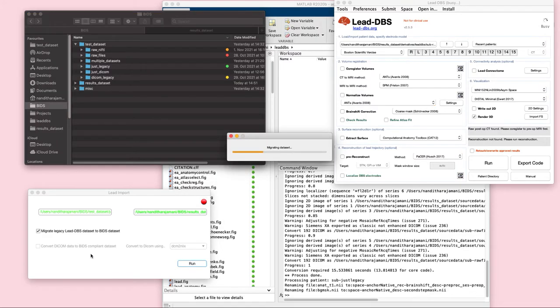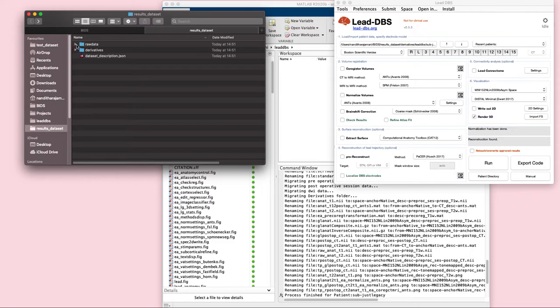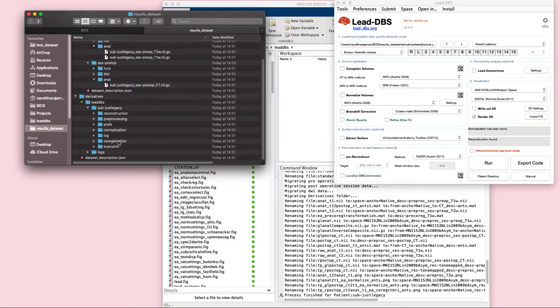And then I run it. So once this is over, you can see that again it is directly loaded into Lead-DBS and normalization has been done and reconstruction is found. So in this case, let's take a look at our output data set. It only has two folders because there were no DICOM files. So it contains raw data set, which is the pre-op and the post-op. And then the derivatives folder will now be full and it will contain all the small subfolders.